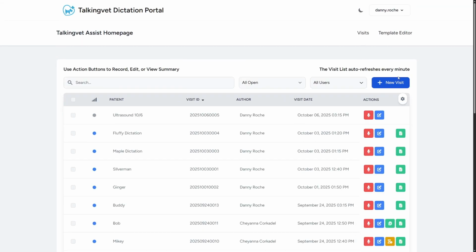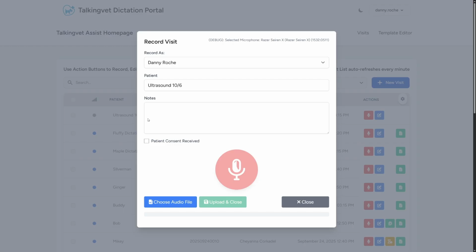So I'm going to do a sample ultrasound report so you can see what it looks like in real time. I already have my visit created here, and I'm just going to go ahead and start recording.